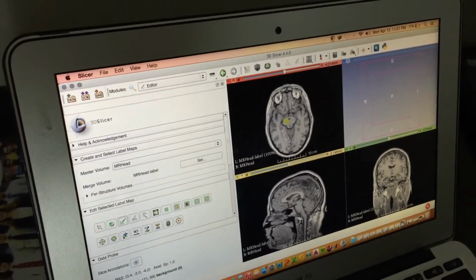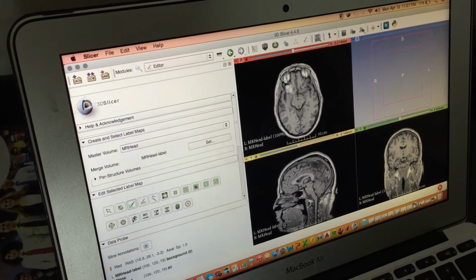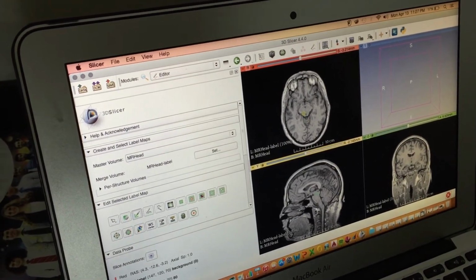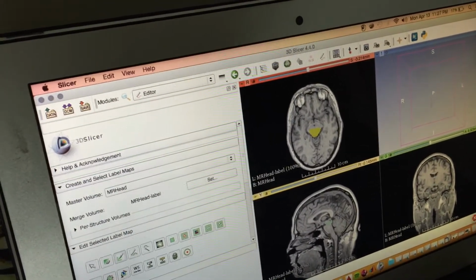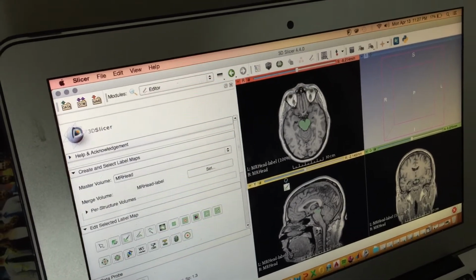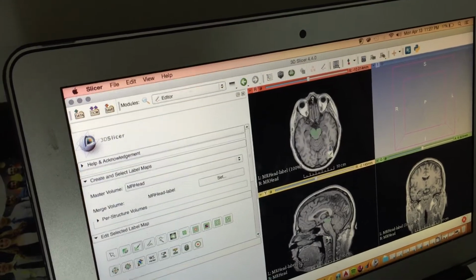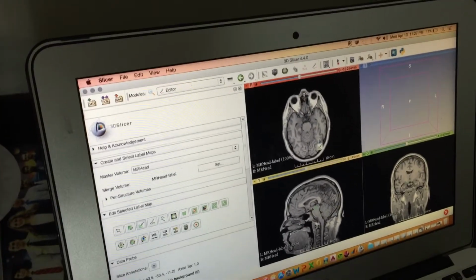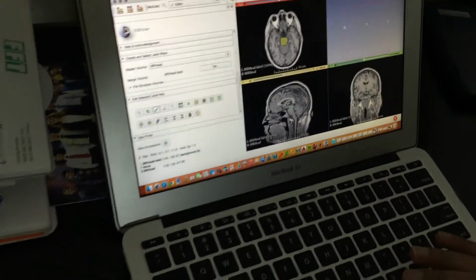But if you can see, it's changing a little. It's going a little smaller right here. Something like this is our area of interest. So I think this should be enough. These are the particular areas that we segmented. If you want, it can actually shrink to a different level too. So let's just take this too, just to show you the segmentations.